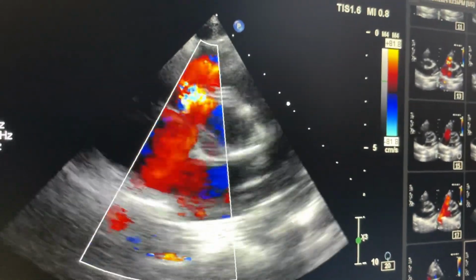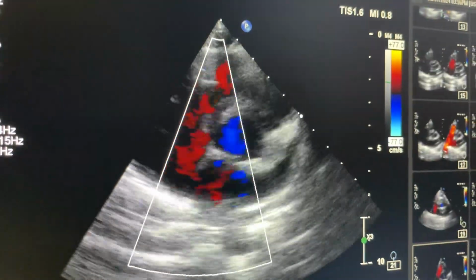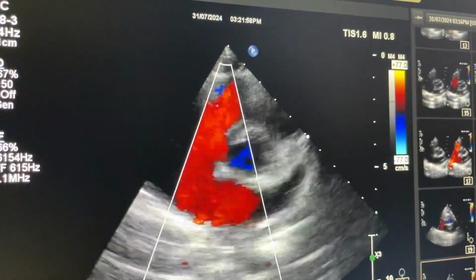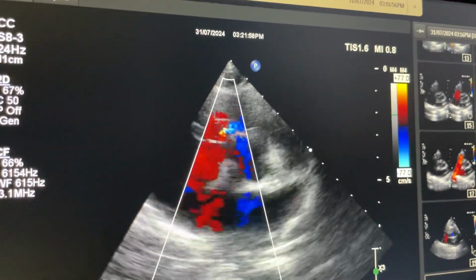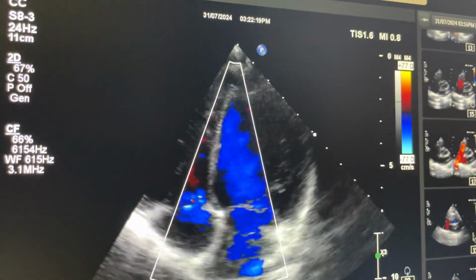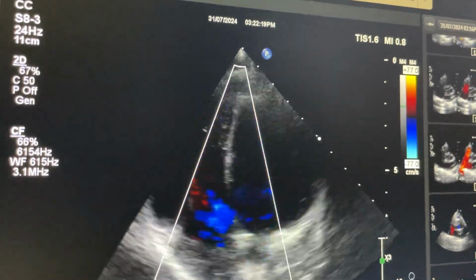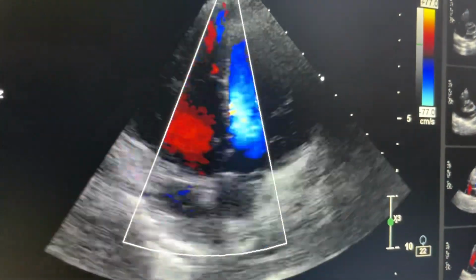In this case the patient is a 10 year old child, so maybe the child could have VSD with Gerbode defect. VSD would have closed, and now the Gerbode has remained as such. This is 4 chamber to 5 chamber view. View is both 4 and 5 chamber coming intermittently in this image.